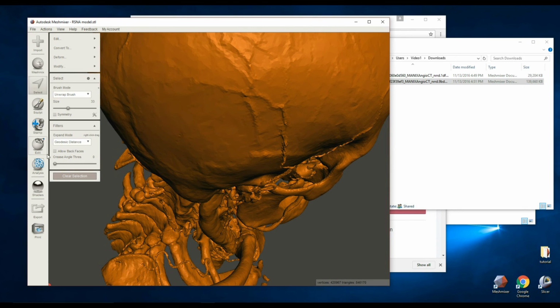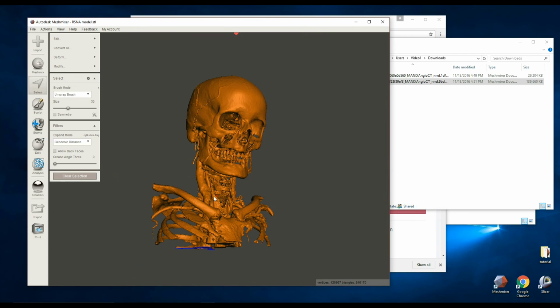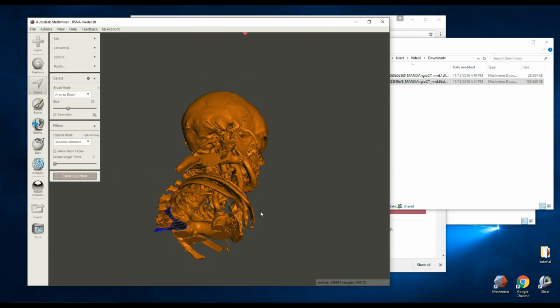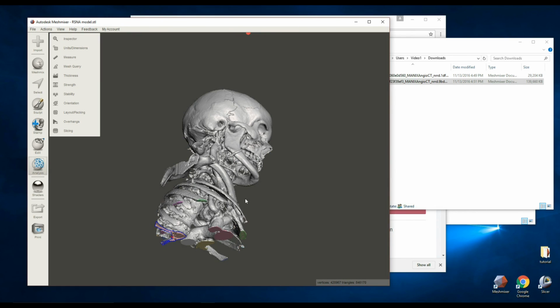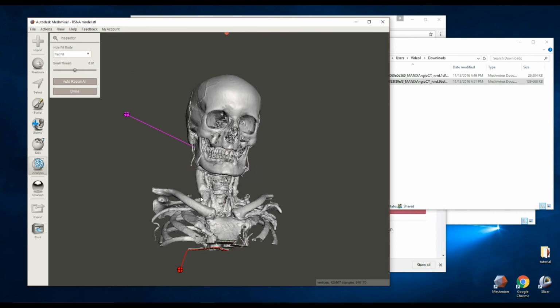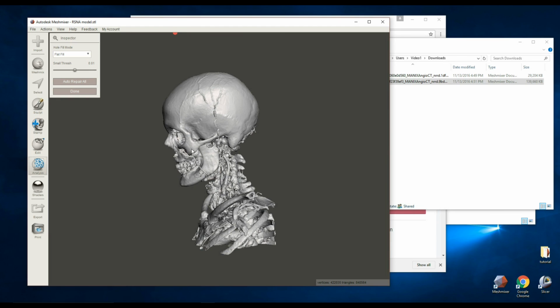Okay, so one of the things that remesh can do is it can help to eliminate any sticky mesh errors that are difficult to get rid of. You can see that we still have some problems down here. So let's go back to analysis and go back to that inspector and see if we can do another auto repair that will fix whatever's left to fix. So we'll go to analysis, inspector. There are still 2 areas of concern. We'll select auto repair, and there you go.